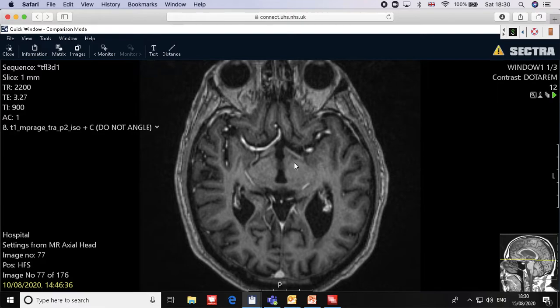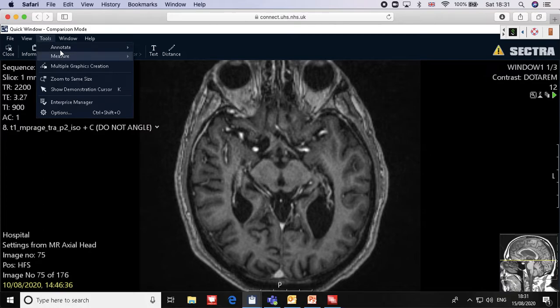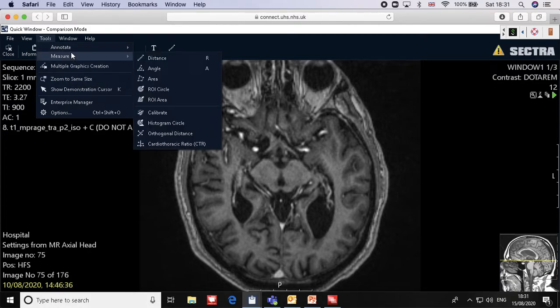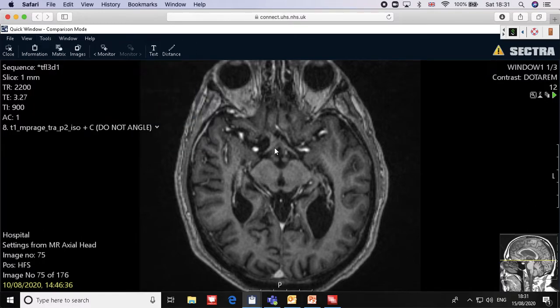What I was telling you is look in between the optic tract. Yeah, this is what we said. So look in between the optic tract, and I told you something called the mammillary body. Look at this. This is the mammillary body. The guidelines would say you can take the mammillary body. So this is the first step. Take the mammillary body. I'm sorry, we don't have a tool for drawing here, but I'm just trying to make it simple for you.